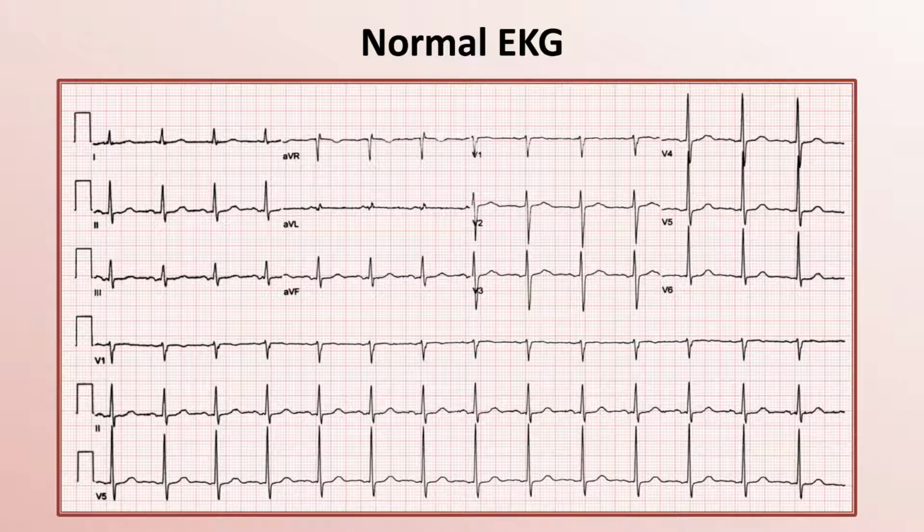However, it is probably rapidly apparent that there exists in the EKG a specific repeating pattern boxed off here. It typically consists of a very tiny wave, followed by a spike, and then a moderate-sized wave. This repeating unit represents a single cardiac cycle, and understanding it will be the focus of this lecture.